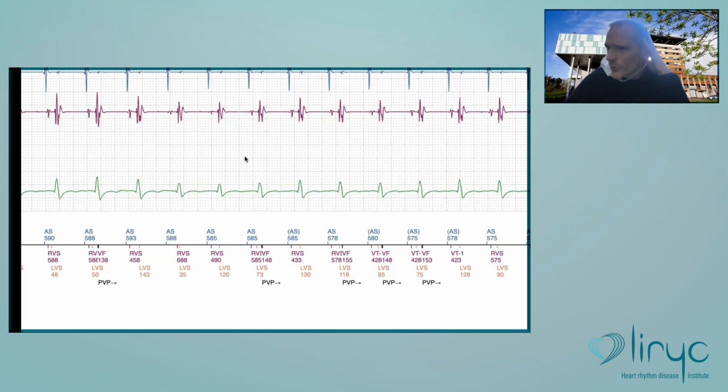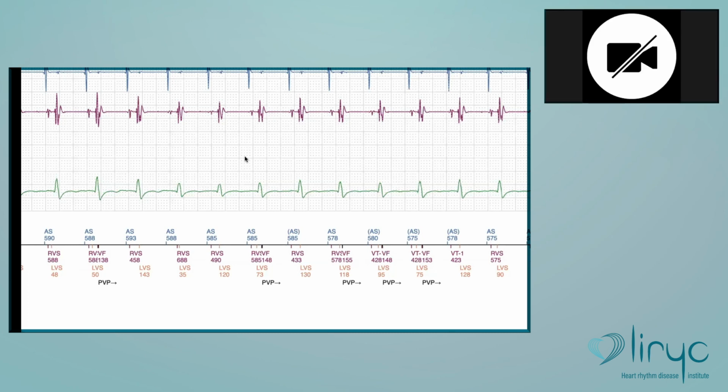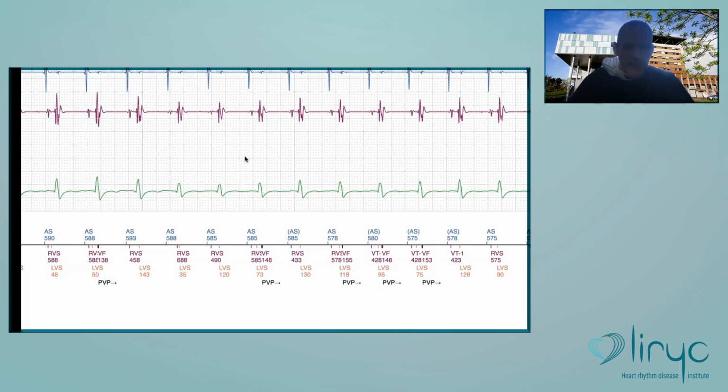So anytime you implant Boston Scientific leads, you need to push them far inside the right ventricle. If you place it at the limit and quite basal with the coil on the tricuspid valve, then you increase considerably the risk of P-wave oversensing. I looked at maybe 2,000 patients, and this is the only patient where I observed this problem. So it's not so often, even in Boston Scientific devices. Even looking at the last 3 to 4 years in this high number of patients, it's not so frequent either.